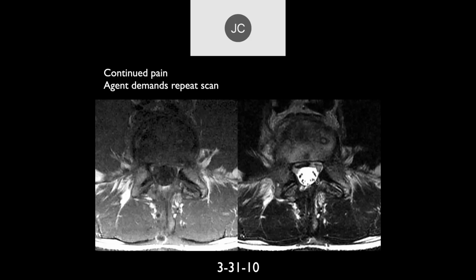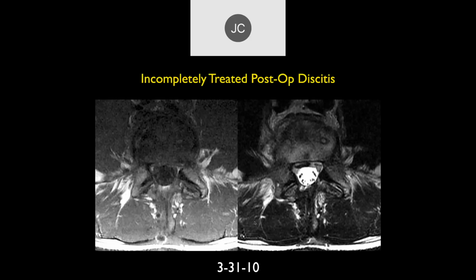That disc is gone. Forget that disc. And there's where the surgery was. Probably would get fused. So that was just incompletely treated. It really needed to be drained and much more antibiotics. And obviously it ended his career. That's too bad.